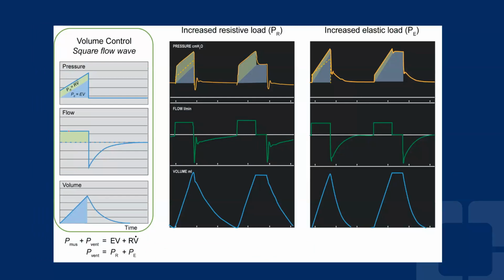The next one is again another before and after. So what happened from A to B? We just reviewed, well, actually I painted this by error, but it's the same. This is a flow control, a square waveform. And again, there's a pause. So you see the peak pressure and then the plateau. The difference between these two is a manifestation of resistance. However, here what you see is the flow is controlled, and you can see the next one.